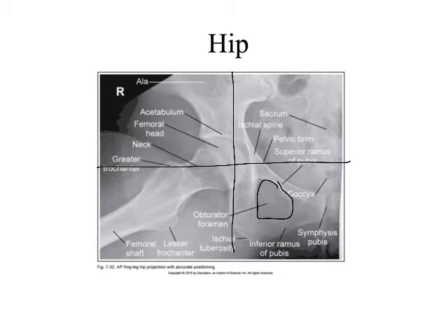People sometimes, if their hip is hurting, they're going to start to favor. They're going to pull. They're not going to want to rest it on the table, right? So this is one of the first things that we can look at to make sure that we're not getting any kind of foreshortening or distortion of the joint caused by rotation.